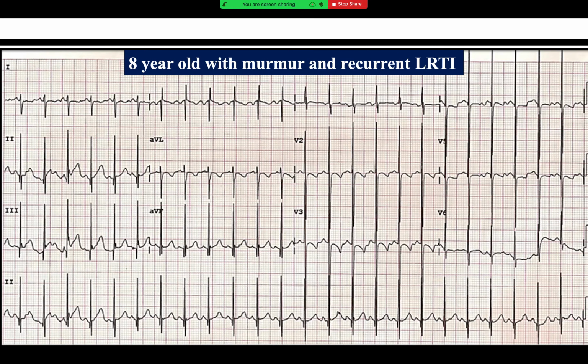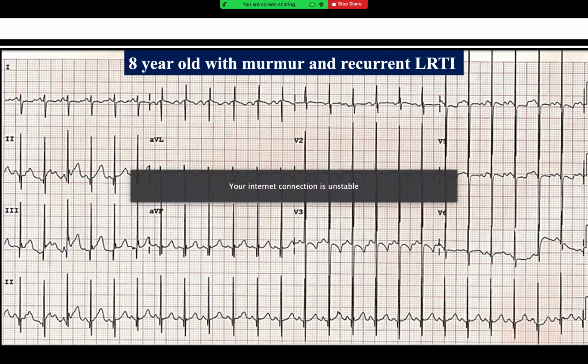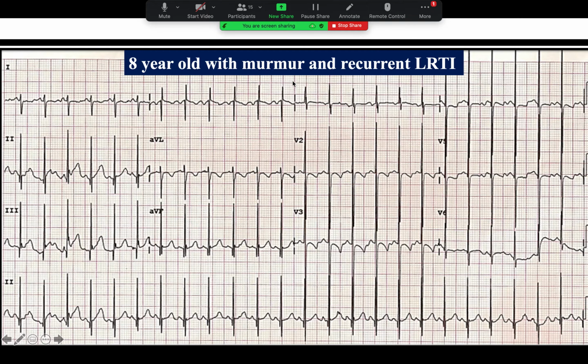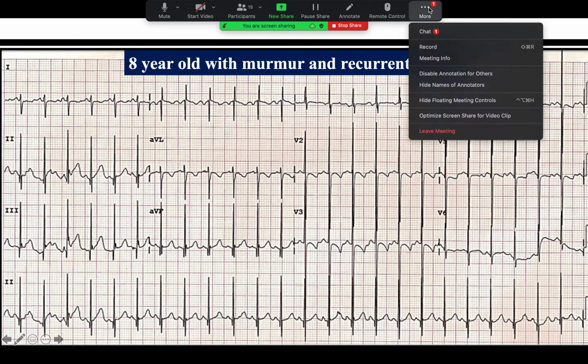How about this young guy? What do you notice in this one? Okay.